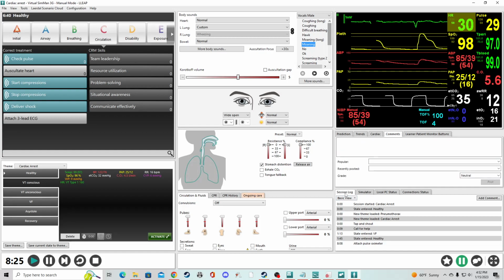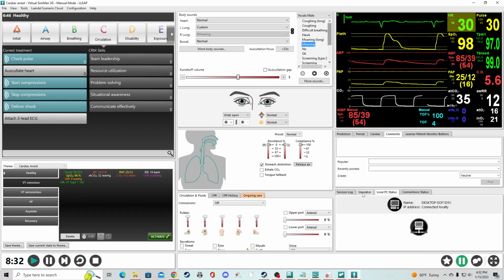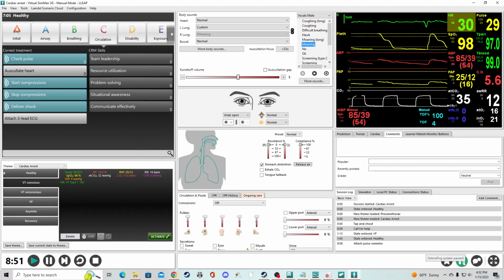And then next is the session log, and these others are just kind of technical tabs, which can help you with troubleshooting, but you just leave it on the session log because that's going to contain the information that you have. Hopefully that's just a quick tour. We're going to look more in depth at some of these things, how to edit them, but at least now we know what windows we have available, and when we're making buttons, we know what they're going to show up as.